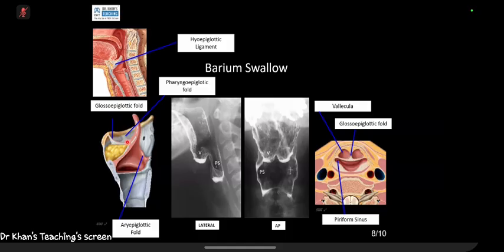You know, the glottis or larynx in the ENT world has three parts: the glottis, which is the true cord, the supraglottis and the infraglottis, right? This is supraglottis, so nothing to do with you. Having said that, on a barium examination, you should understand what the anatomy is. So anteriorly, if you see on a cross section, this is the glossoepiglottic fold.